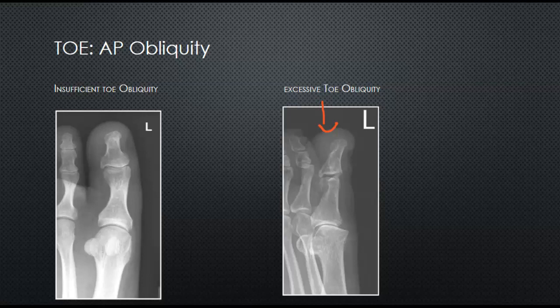And also, you will see that the proximal phalanx midshafts are demonstrated with more concavity than the anterior aspect of it. You start to see that the toes start to superimpose as well, and we want to free that up. We want an oblique, so you are going to have to bring that foot back down to that 45 degree oblique.